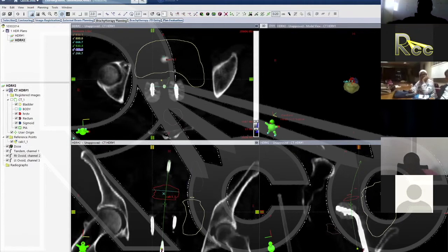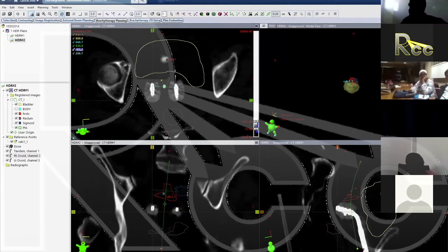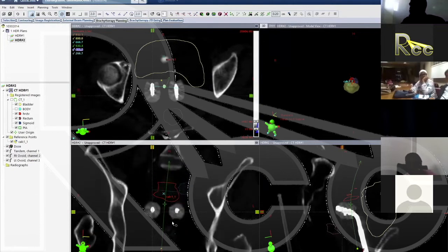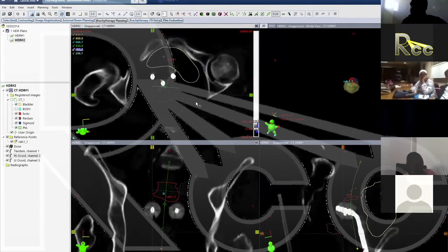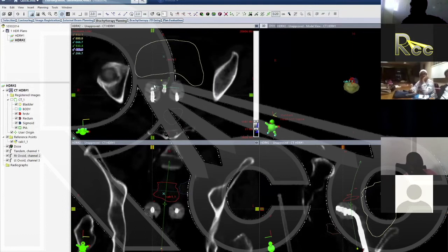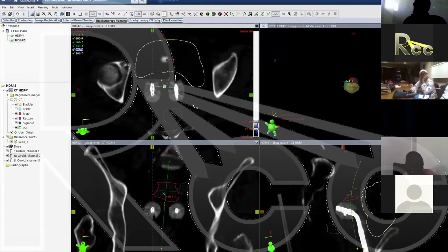So now I'm going to scroll through here again after that adjustment, and I can see maybe coming off a little bit at the tip. So I'm going to go back up to the axial image, scroll through that. It actually looks pretty good on the axial image. Again, just looking at this right ovoid, I'm happy with that on the axial image. Okay, and then if we go down to our bottom right image, we can see we have this really nice, well-defined end of the right ovoid.